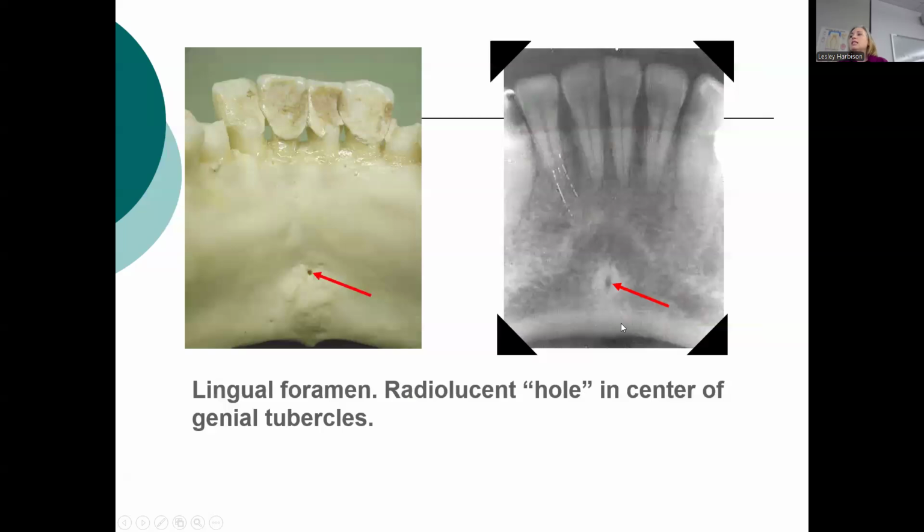The other thing you can sometimes see is the edge of the mandible. As we come around, you can see the terminal edge of your chin, the angle of the mandible, the border of the mandible, and then you just see airspace. This is just air, but this is the thick bordering of the bottom of your mandible. So sometimes you can see that too, if you are ever curious what you're looking at.